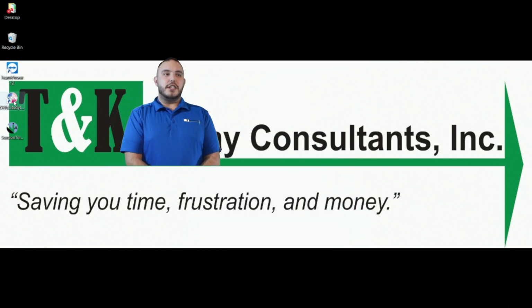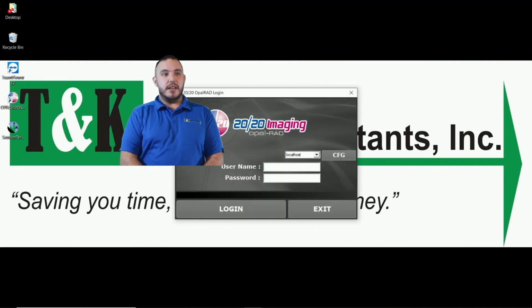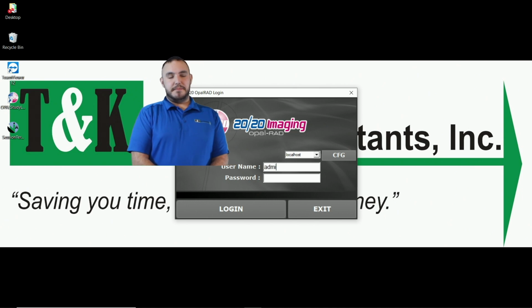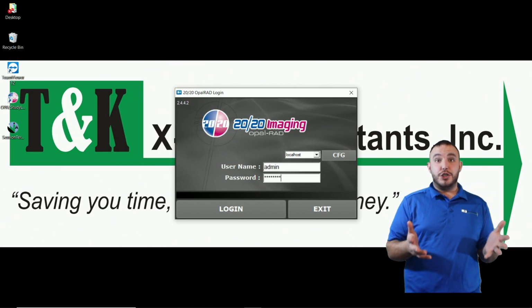So the first thing you're going to do is navigate to your Opal-Rad software, enter your login right here, and then you're going to click Login. So the first thing we're going to go through is how to shoot an X-ray.